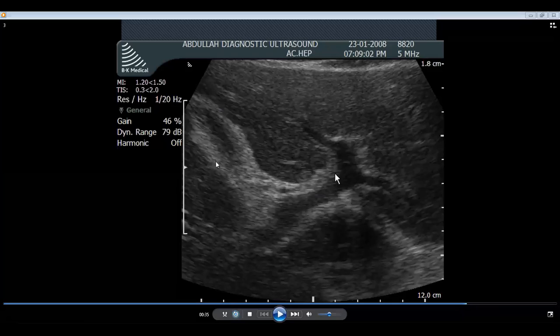Look at the gallbladder wall, which absorbs the edema from the edematous inflamed liver capsule, and thus becomes markedly edematous. There is very little bile inside because the liver is acutely inflamed, and very little bile this liver is producing at the moment.